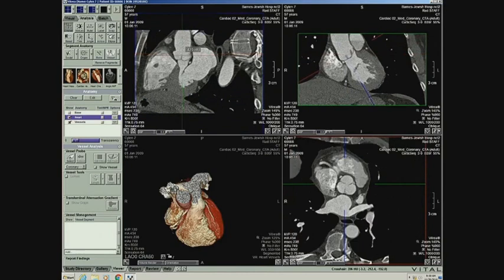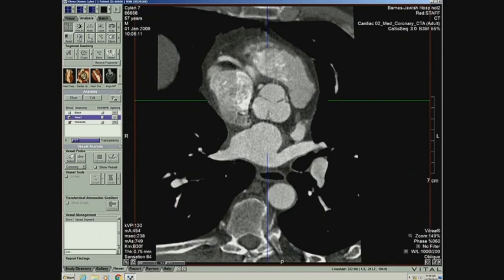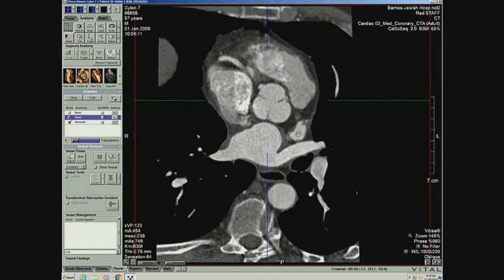On both of these, the red line is parallel to the aortic valve. We look at the sinus, and looking at the aortic root now, it looks like a clover again. This one is facing the sternum, it's the right one. This one is facing the interatrial septum, it's the non-coronary sinus, and this one is closest towards the left atrial appendage, this structure here is the left sinus.